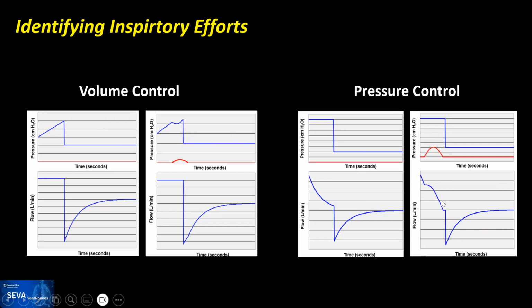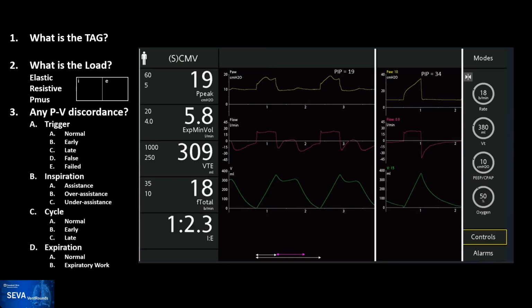We've gone over this many times, and now we're going to see how this applies in an actual case study. All right, I'm going to turn it over to Ariel Garnero. These were some screenshots that he made on an actual patient. And we're going to start off as usual, identifying the tag. So go ahead, Ariel. Thank you, Rob.